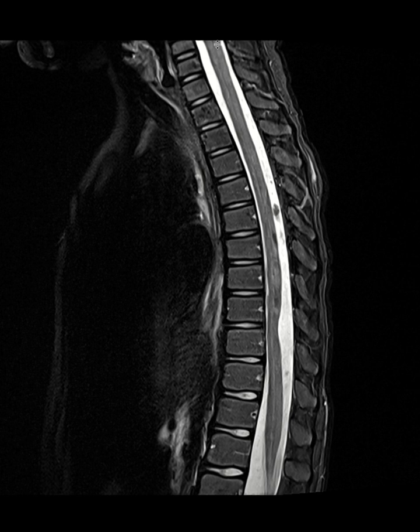When you look at this, there are some areas of abnormal signal, but these are usually artifacts, specifically in a kid who cannot stay still that much in the scanner. This is a CSF flow artifact, so we are just going to ignore that. But if you look at the spinal cord at the mid-thoracic level, about T8 to T10, we see some smooth indentation of the dorsal aspect of the cord right here. Everything right there is CSF iso-intense, as you see, it's all bright. So let's look at it on other sequences.